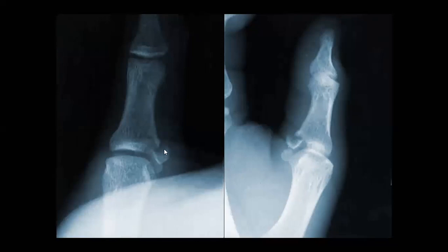So this thumb. What is the issue in this thumb when you find this appearance? Will you go to do MRI or not? And why do you do MRI? They have many questions here in the MCQ, and they like it in the exam. Why? Because you want to exclude Stener lesion. Perfect. So this is what you should be aware of, what is called the Stener lesion.